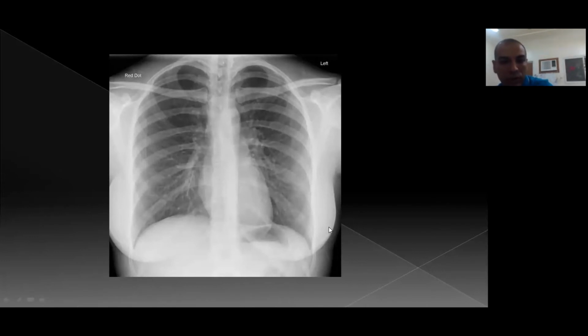We will now shift to the 3B. 3B, behind the heart, it's clear. Below the diaphragm, it's clear. Diaphragmatic lesions, it's clear. Breast shadow, it's clear. From midline, any lines? No lines. Mediastinum, clear. No paratracheal mass, nothing like this. We don't have any hilar masses. Hidden areas, hilum. Apex, hilum, behind the heart and below the diaphragm, we don't have any.